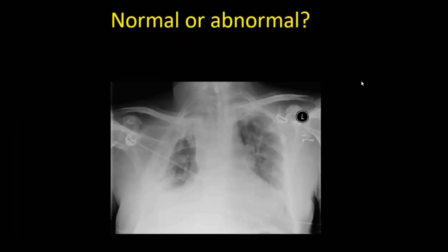So is this appearance normal or abnormal? This is certainly an abnormal appearance, not for the right side, but I'm concerned for the left side. As you have mentioned that there is a right-side pneumonectomy, I would be expecting that the volume would be low, but on the left side there is significant opacification. Bilateral CP angles are blunted.